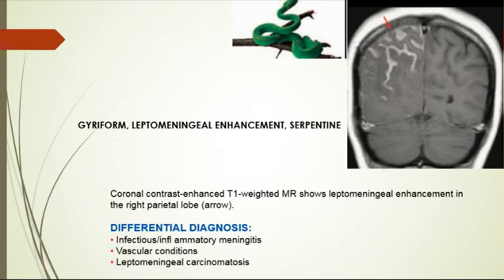Vascular etiology includes acutely reperfused or subacute arterial infarctions, posterior reversible encephalopathy syndrome, PRES, vasculitis, and vasodilatation associated with migraine or seizure. Typically, the subjacent cortex is also involved in these conditions. If the gyral cortex is not involved, it's against. Okay?